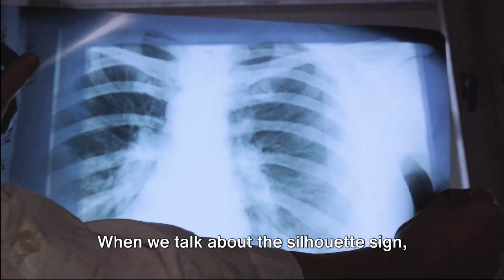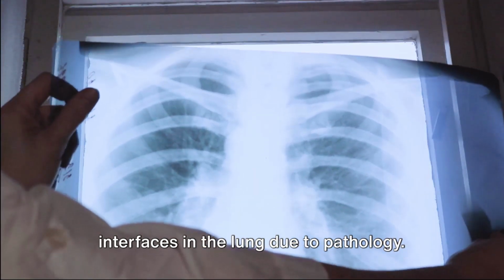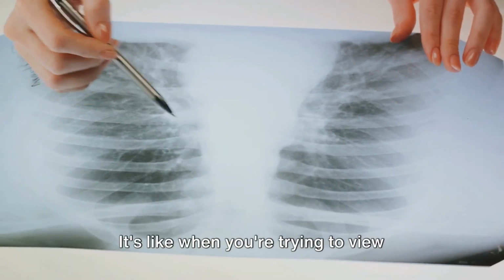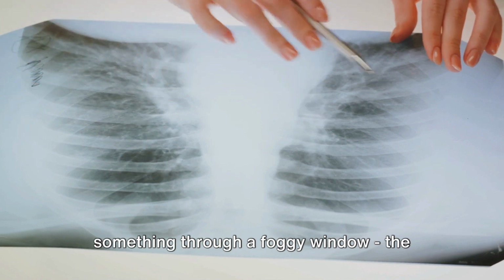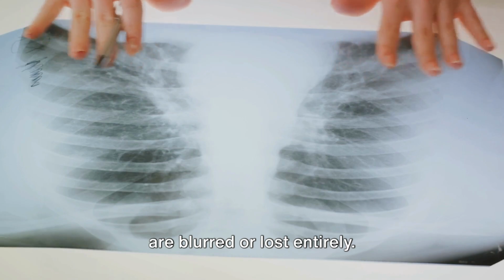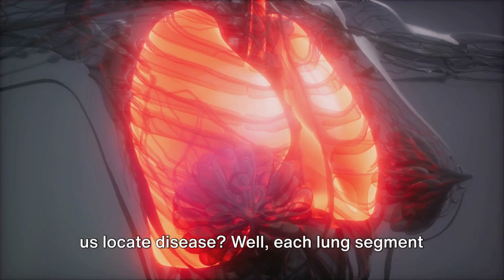When we talk about the silhouette sign, we're referring to the loss of normal interfaces in the lung due to pathology. This could be consolidation, atelectasis, or even a mass. It's like when you're trying to view something through a foggy window. The clear lines and forms you typically see are blurred or lost entirely. Now you might wonder, how can this help us locate disease?